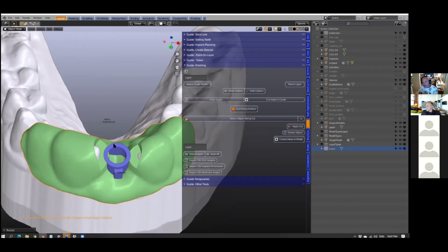That's just merely the fact of how these things work. So like what happened now, all I did is scale it a little bit more or a little bit less, and then it should work. So if ever that happens to you, you know you've got one vertex or edge on top of another edge, and it won't cut, you'll know just to move the object or scale it a little bit, and it will then cut.